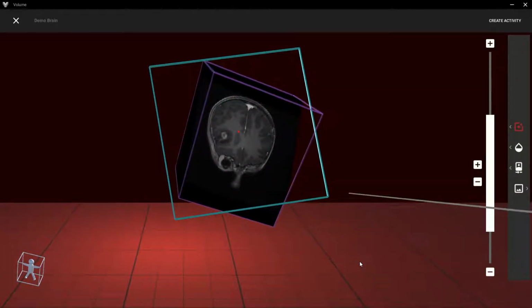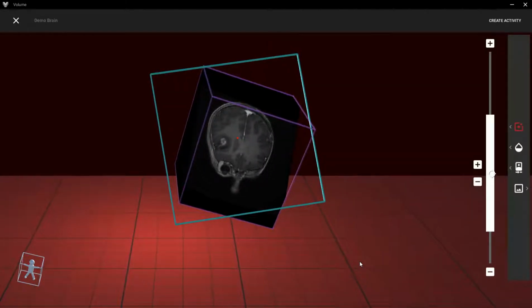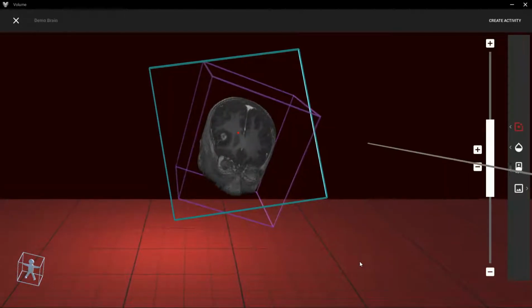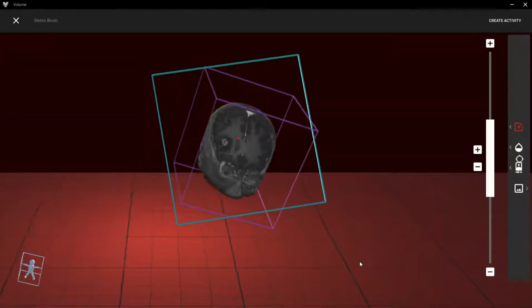You can adjust the range of the ISO window by holding down the oval button while pushing into the screen on the slider. As the slider gets smaller, the ISO window gets smaller. The smaller the window, the more you can isolate what is visible in the volume.